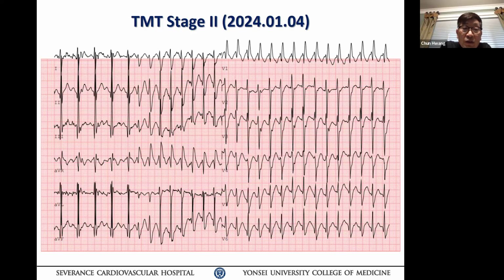In the early literature, if you have fascicular VT and you entrain from the RV apex, it doesn't work very well, but if you pace from the RV outflow tract or high septum, it does. So whatever the mechanism, a very small reentrant circuit involving the septal and posterior fascicle nearby area does not necessarily have to happen. Hopefully sometime we can discuss this issue in more detail, but this is how I would read this ECG.